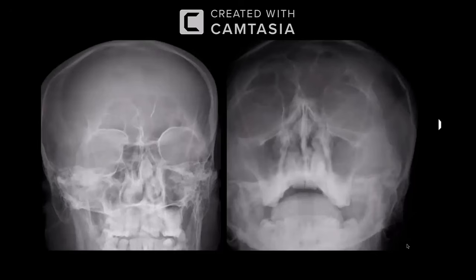Okay. So what will you do next? What is your differential? Yeah, first of all, I will compare it with prior imaging, and this lucency needs further evaluation with cross-sectional imaging, further CT scan.